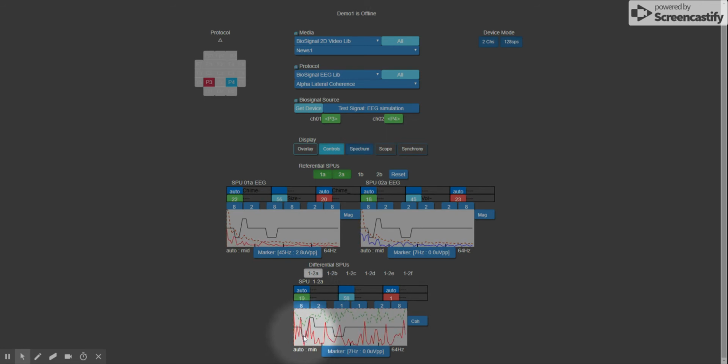And similarly, if there's a spike in coherence in the inhibit bands here and here, then an inhibit will be generated. Let's talk about thresholds. These green lines up here. When the signal exceeds the threshold, that is the signal to generate a digital reward, a logic reward, or inhibit, indeed. Green for reward, red for inhibit. They're actually overlaid in each at the moment, so we can only see one because the smoothing filters are the same for both. These are reward smoothing filters, inhibit smoothing filters.